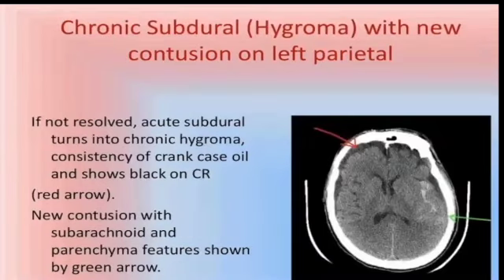Now here we're seeing a chronic subdural hematoma, and as I said, with patients who get a subdural hematoma, we're thinking of elderly patients or alcoholic patients, and what's common between both is that they fall repeatedly, and because they might not have any symptoms or any fracture in the skull bone, it is very possible for a patient with a subdural hematoma to not present to the emergency room. So this is why we could start seeing chronic subdural hematomas on CT images.